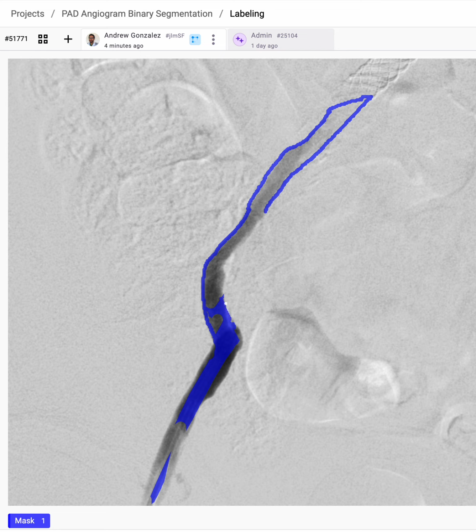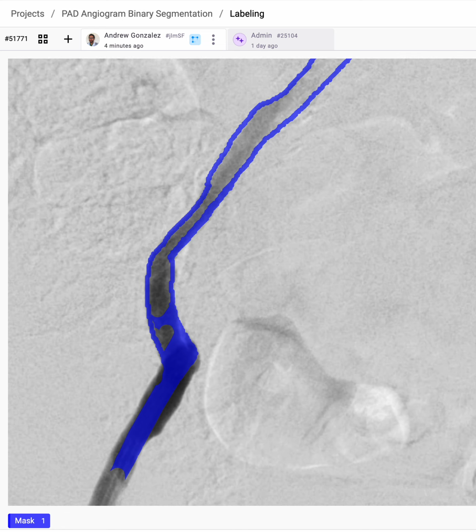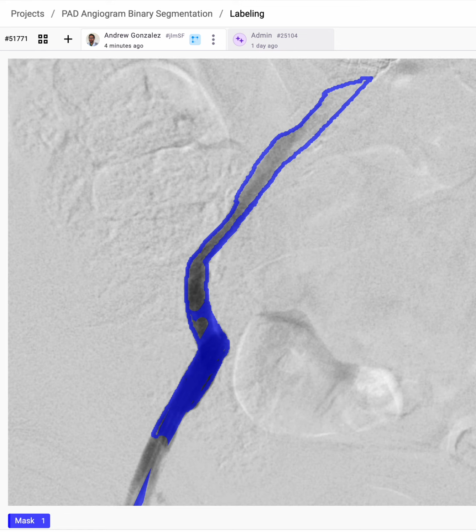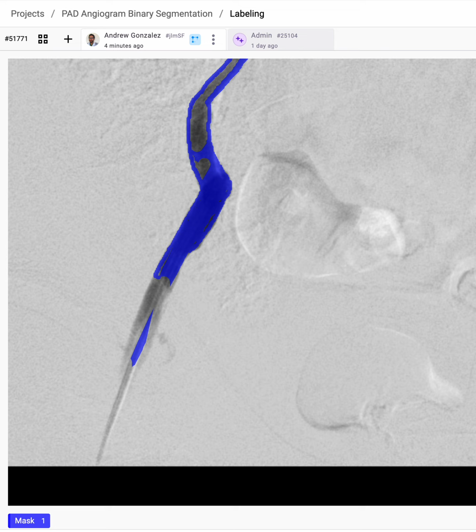All right. That to the edge a little bit more. All right, so now that we're outlining, we'll zoom in a bit. That edge. Go here, get that edge. All right, good. So that's all mostly outlined. Go down here. So now we have to figure out what we're going to do with the catheter.